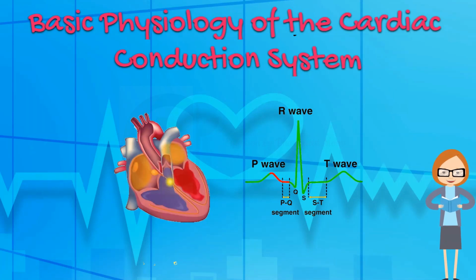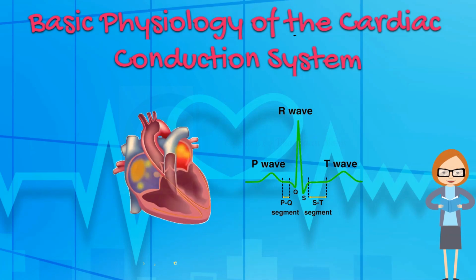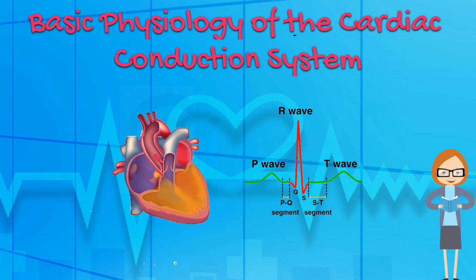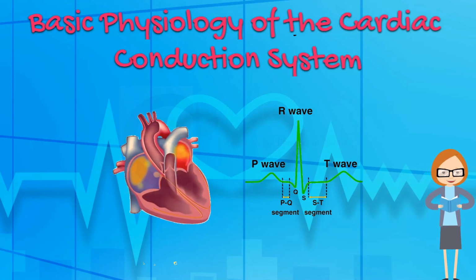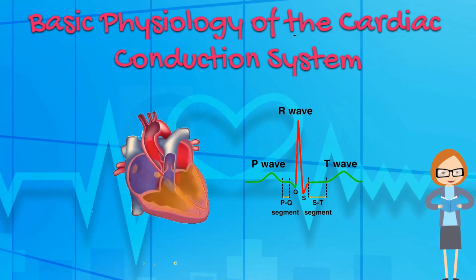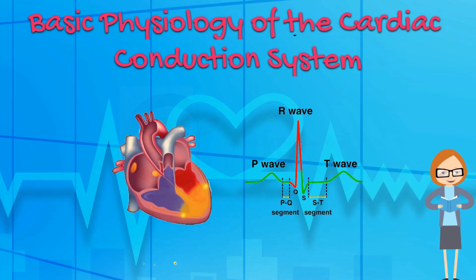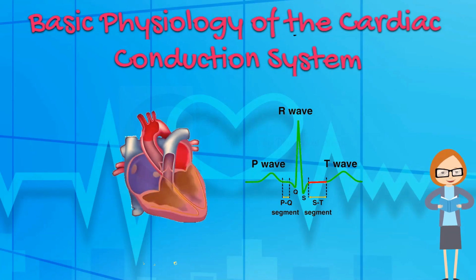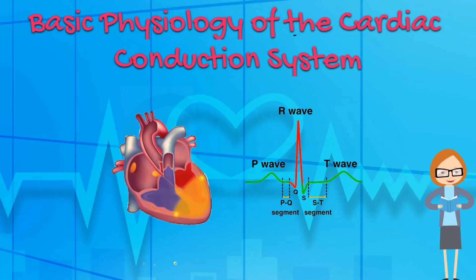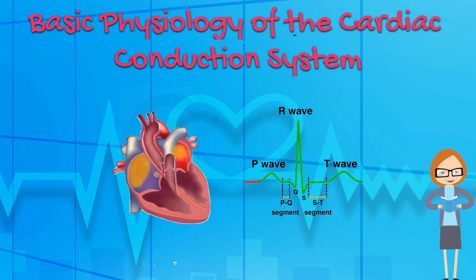At the level of the atrioventricular or AV node, the beat is conducted to the ventricles, over the His bundle to the right and left bundle branches, and the Purkinje system. The resulting atrial repolarization and early ventricular depolarization result in the QRS complex. Ventricular depolarization and subsequent repolarization lead to the completion of the cycle, forming the T wave. The periods between each wave and complex are made up of intervals and segments.